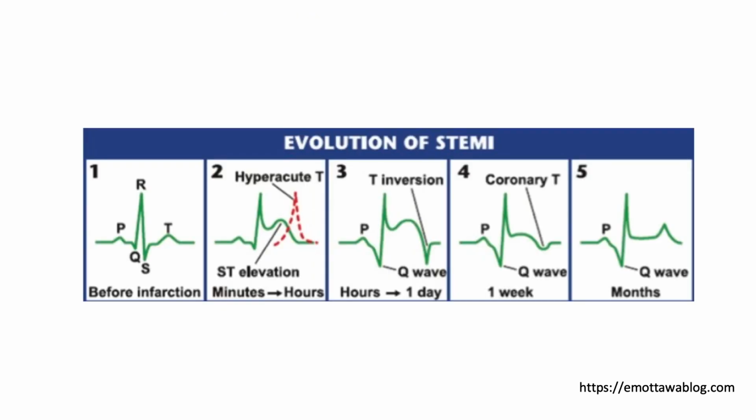So in the setting of ST elevation MI, this is the evolution of how the QRS looks in the ST segment. Before infarction, we have a normal trace. Then minutes to hours just after the infarct, we may have ST elevation. We may even have hyperacute T waves.